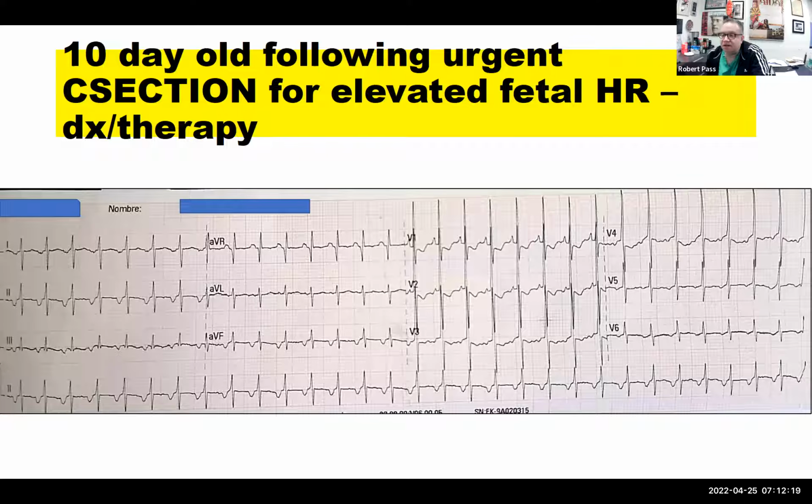The other thing that goes against this being EAT is the relatively normal or even short PR interval. Now, you can't hang your hat on this, but most of the time when someone is in EAT, their PR interval is long. They often have first-degree heart block when they are in tachycardia. This patient clearly does not. And then the last thing that goes with it being PJRT, although it still could be EAT, is the fact that, as you said at the beginning, Sergey, you have these inverted P waves in the inferior leads, which suggests it's in the posterior septal region, which is the most common location that PJRT pathways are located in.